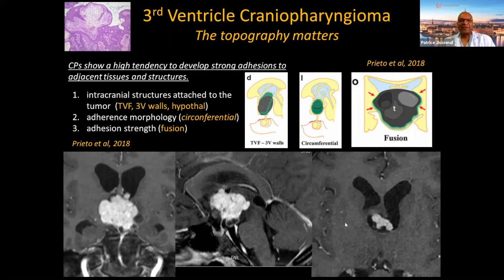Thank you. So 55% have the correct answer, that a third ventricle mass in a young adult with few cystic components and no calcification is likely a third ventricular craniopharyngioma. I don't know if ASL can help and even spectroscopy, but if you have all those features that I have presented with heterogeneous enhancement, you can definitely make the diagnosis of third ventricular craniopharyngioma and even report the case because it's kind of rare. Thank you for your attention.